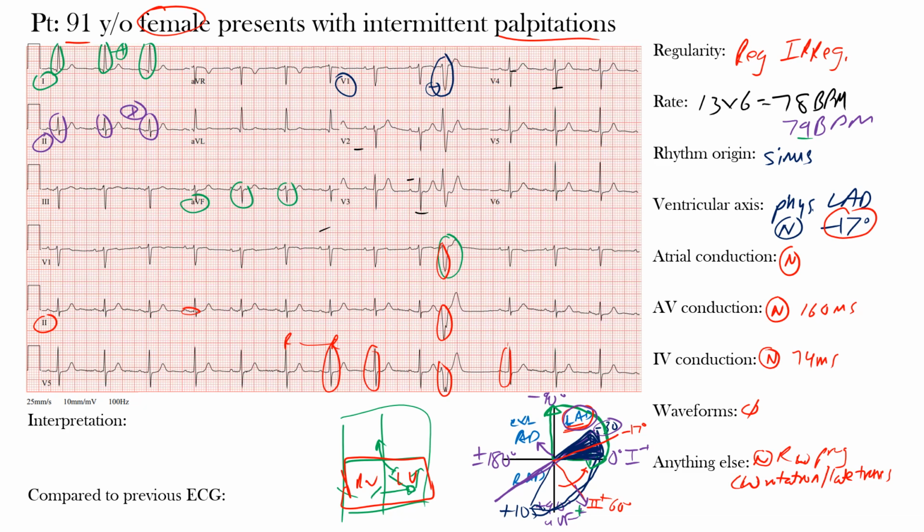Well, imagine lead V1 sitting over that right ventricle. It's one of our right precordial leads. If you have the ectopic focus originating from within the right ventricle, it's going to head away from it. So if you imagine V1 somewhere in this region and you have the complex originating from here, it's going to head away from it, so you'll see a negative complex. Whereas if you have the left ventricle, which sits more posteriorly, and you have an ectopic focus, it's going to depolarize more anteriorly, and you'll see an upright dominant R wave. So a little more advanced, but some of you may like that stuff. Hopefully that was helpful.